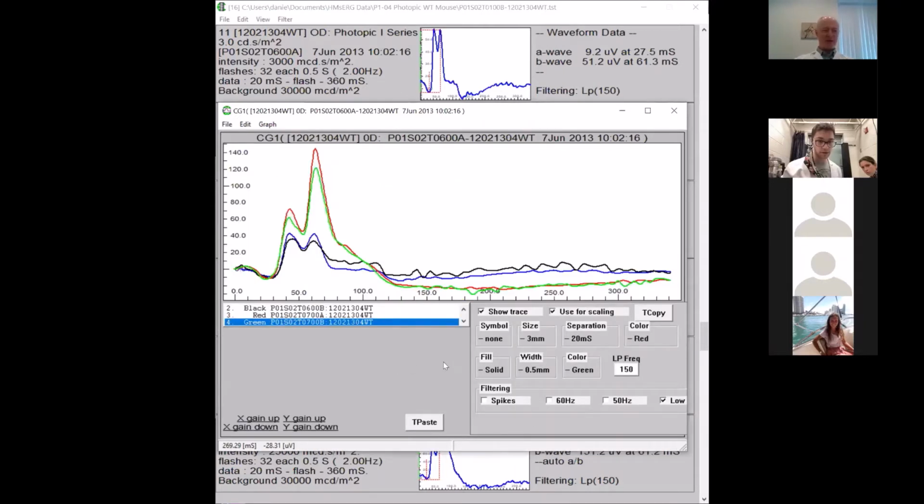So now you have these waveforms. The next part is, if this is data that you want to publish, we have the ability to come in here and put different thicknesses and different colorizations for each of the lines. So you can come in here at the green and make the size of this different.